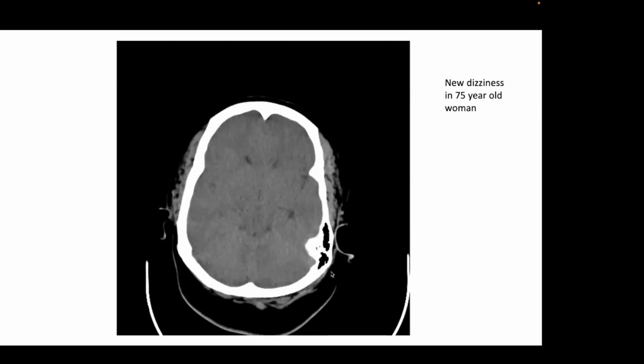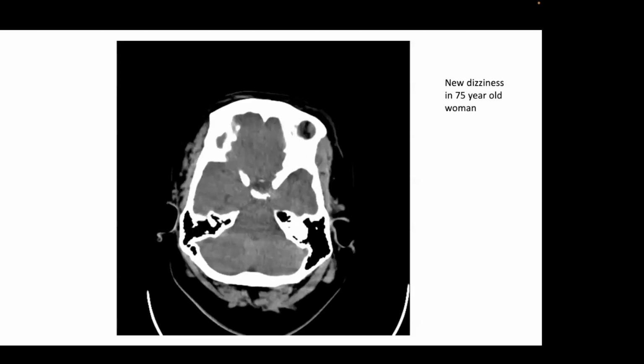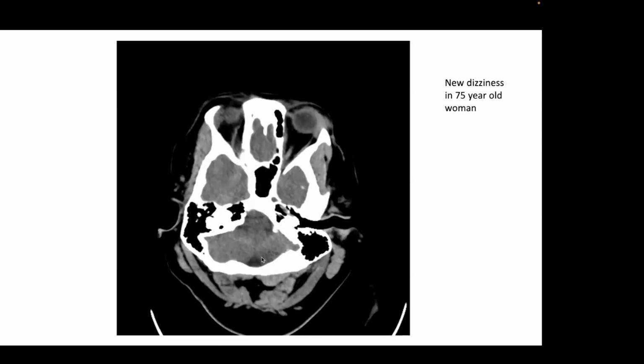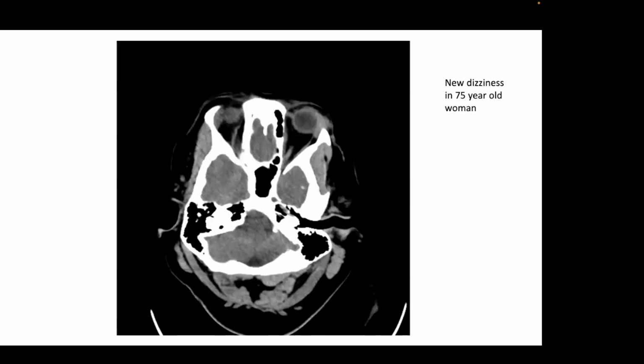If you're very sensitive, on the sensitivity scale, you want to call everything. You might say something about this, but we know that in this depression in the skull, we often get beam hardening artifacts. So if you call this an infarct, you would be overreading the scan. And then as we get down into the lower sections, you have these artifacts that go across the cerebellum. Would you call that an infarct? Probably you shouldn't. But for this patient, I'll show you the MR scan.